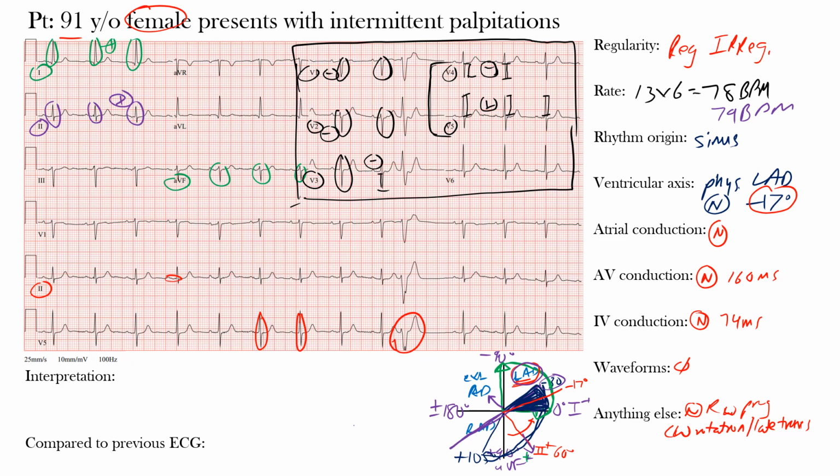Notice that it's not preceded by a P wave and is a wide complex. It is a wide complex because it's originating from within the ventricles and outside the normal conduction pathway. You can think of the normal conduction pathway as being the highway system and the fastest pathway to depolarize the ventricles, which typically gives you a narrow QRS complex, as we see in most of these complexes.